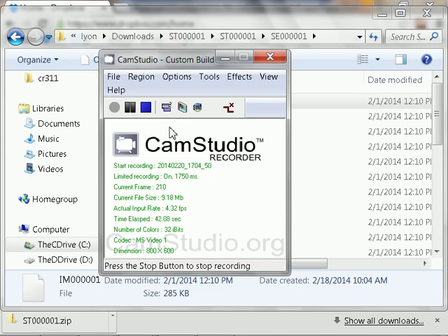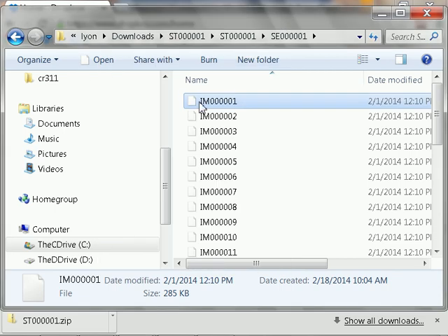Unfortunately, they're in some wacky format. And the first thing I like to do is try and figure out what kind of format images these are. So these are real medical images in some real wacky medical imaging format, and I don't know what it is. I think it's called a Dicom imaging format. So, first question is, how do we determine what the format is of an image?